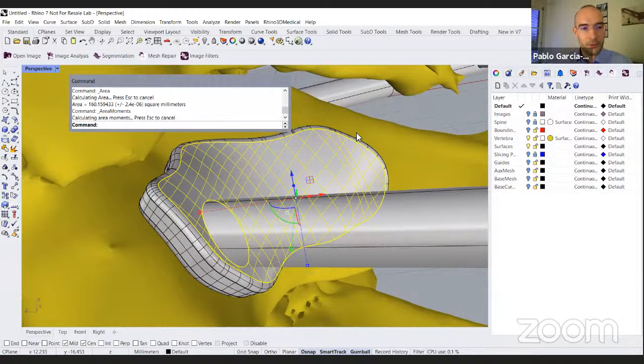We guarantee results for bone tissue, and you can try for lung. The model that I showed you in the presentation was a full lung, and it had the negative shape of the airways, but we couldn't segment them one by one. You can have a broad estimate of the airways, but it's hard to segment one particular airway. It depends on the resolution of your scan. So I would advise you to try it with your scan, and then you will discover. By the way, you have a free trial license of the software, so you can just try it.